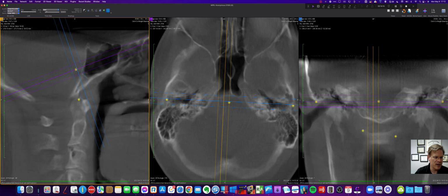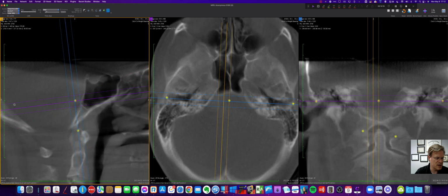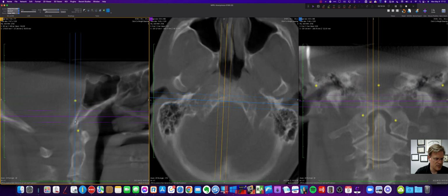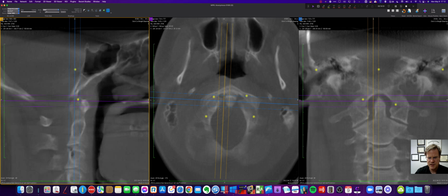I'm going to bring it back up here to kind of straighten it out. Actually, I probably could have just straightened it out right where it was, because I'm trying to get it to the floor. Good. Bring it back down. All right, now I'm looking in the center, and now I can see. Now you're not seeing the nice joints, but you can still see where the joints start and stop, or at least where the angles are.